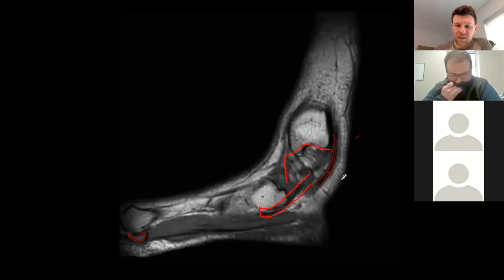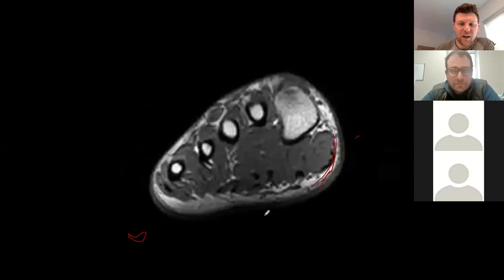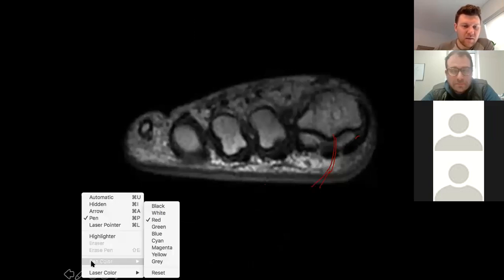All right, let's see your patient. You can come get me up. Okay, we've got a few axial. We've got about 3 axials to go through. Anybody want to start?